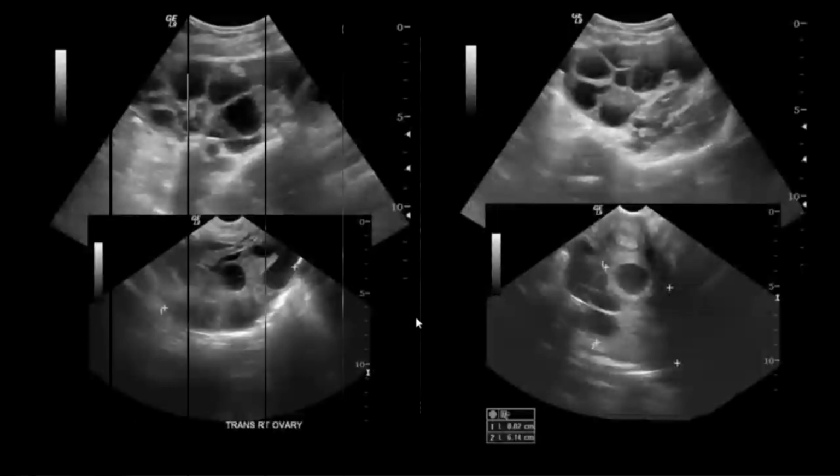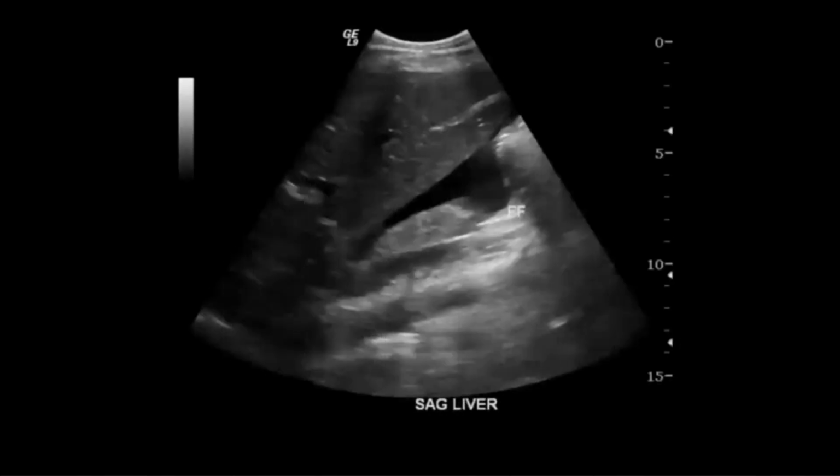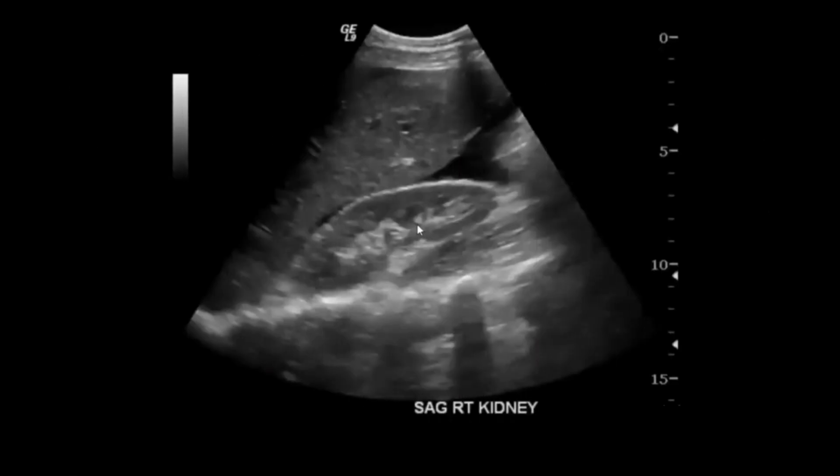To summarize the radiographic findings, it typically shows bilateral, symmetric enlargement of ovaries, often more than 12 centimeters in size. Multiple cysts of varying sizes are noted in both the ovaries, giving the classic spoke wheel appearance. Associated findings of ascites and pleural and pericardial effusion can be noted.